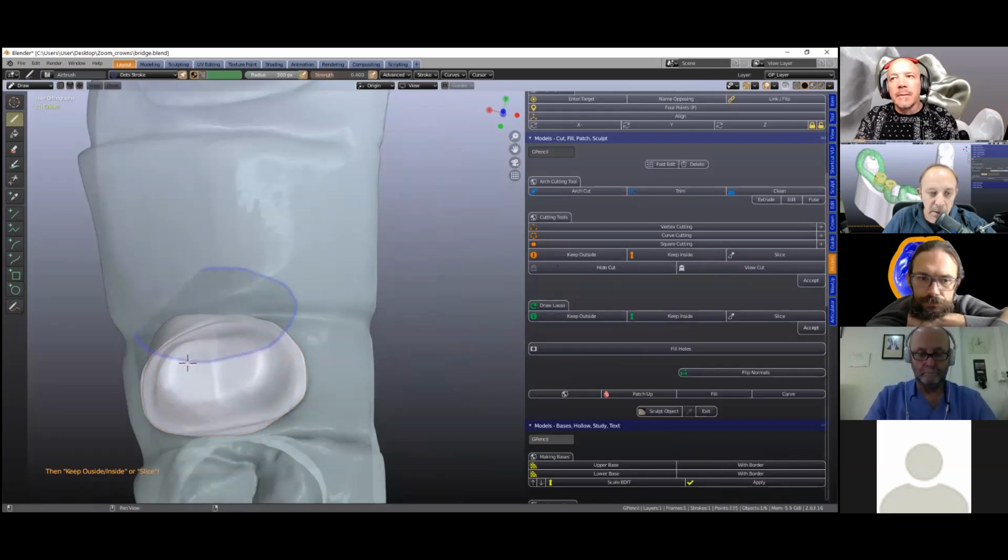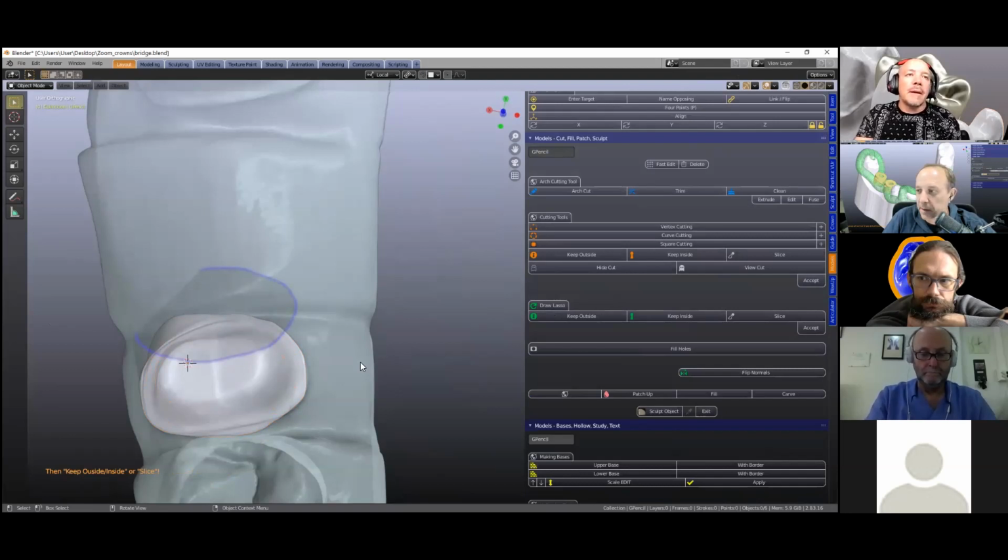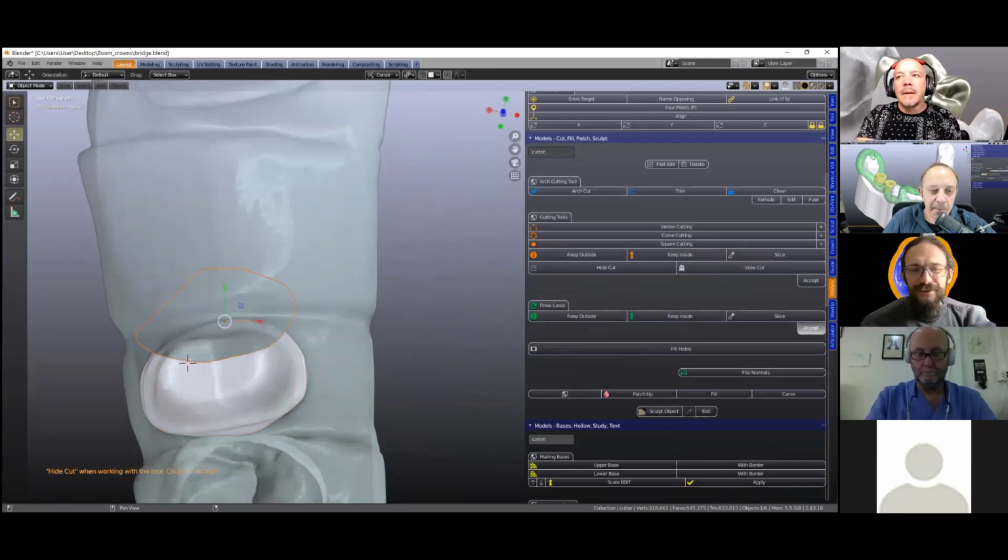Now you're going to take the whole margin with it. Am I? Yeah, but you just have to tilt a little bit more. And I understand. So now you can just print it, put it on your tooth, and do the cutting. Yeah, that's right. You can put it on the tooth and nip off actually where you need to cut.